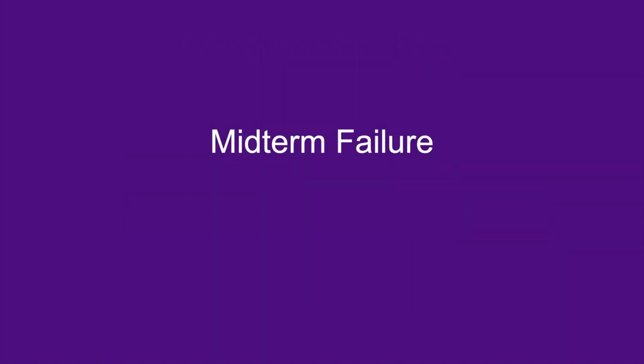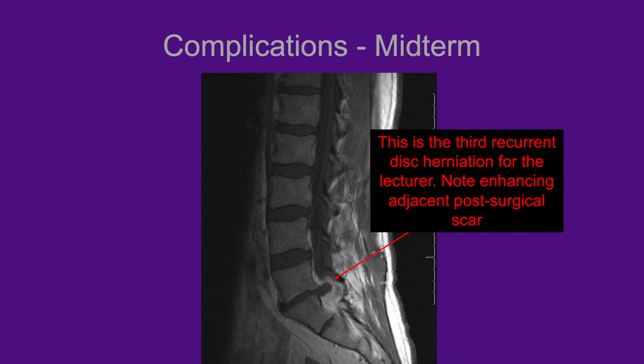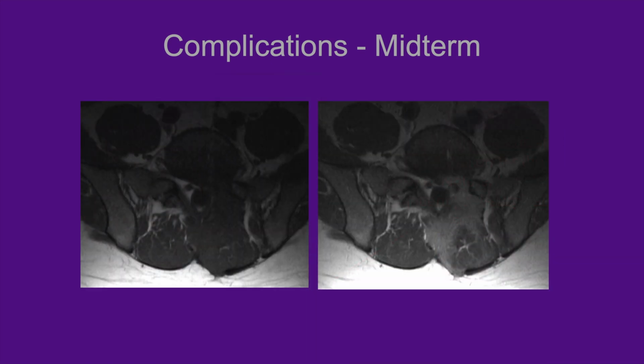Moving on to midterm complications, we can have reherniation of disc material. This is my third recurrent disc herniation. Yes, that is my spine.